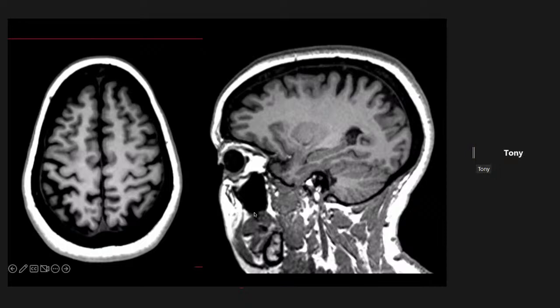So we have an axial and sagittal T1. Kind of seeing diffuse global volume loss predominantly in the area around the central sulcus, more so than the rest of the brain. It's bilateral. It looks symmetric. I'm not really seeing any infiltrative process or anything. No, I agree.